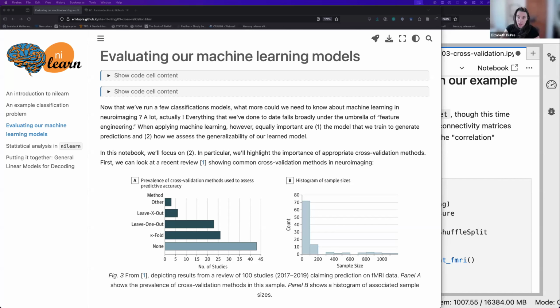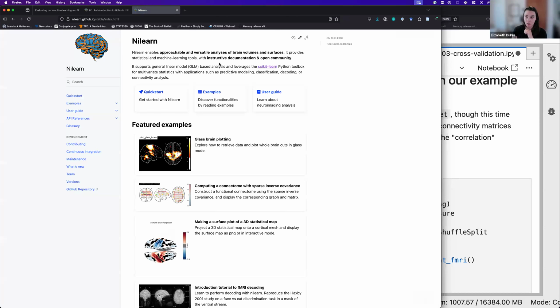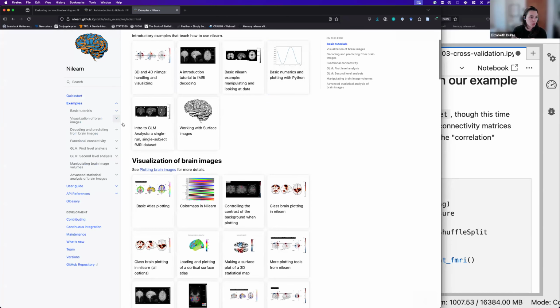Yeah. So the question, as I heard it, please correct me, is, there's different ways that we can divide data to use in a masker. In Nilearn, we could do clustering with Nilearn itself, or we could do a predefined atlas. And so one, are there examples? Yes, let me pull some up. But then two, what are the advantages and disadvantages? So first, hopefully I got that right. First, let's just show some examples. So if we go and we want to do clustering, what's the best way to do that?